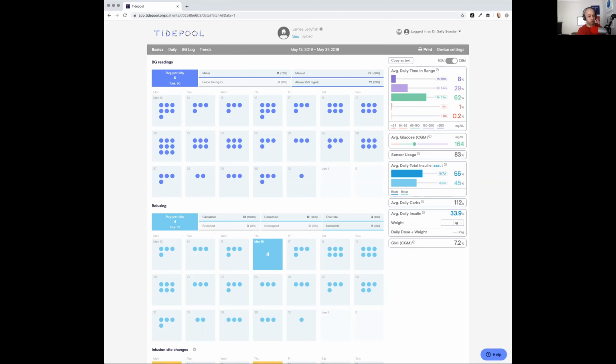When it comes to the basics view here, this is going to be showing you up to 3 weeks of data based off of the most recent upload that you've done. So you can see right now, based off of when the last upload to this account took place, that's going to be May 13th through the 31st of 2019. There are reasons that this account has slightly lower data, but the actual data display doesn't necessarily matter here. But when it comes to the basics view, a few things to keep in mind.